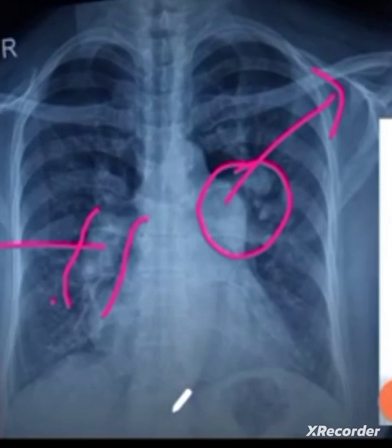Now, that may be due to any cause. That may be primary or idiopathic pulmonary hypertension, or secondary, and there are 5 WHO classes. We will discuss the algorithm for pulmonary hypertension in the next lecture. But right now, just focus on this chest X-ray with a positive pulmonary bay sign, which indicates pulmonary arterial hypertension.